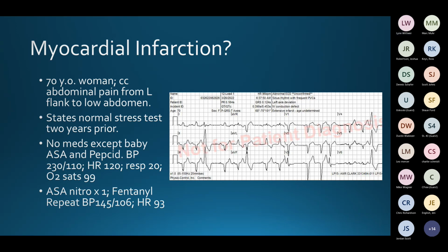Her pain was better. The machine reads it as having an extensive infarct, age undetermined. Well, but look at this. It also didn't read the left bundle branch block.